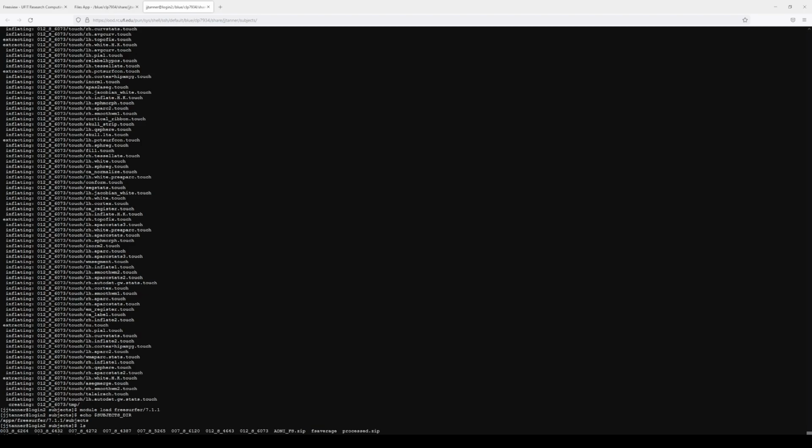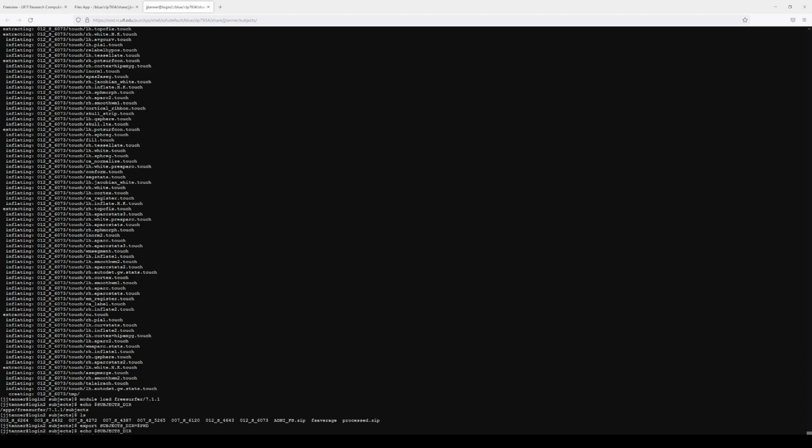So now if we look back at this command, I did echo subjects directory before, and I got apps FreeSurfer 7.1.1/subjects. I'm going to run that same command. I hit the up arrow on my keyboard, and I run that, and now it is blue CLP7934 share JJ Tanner subjects. So I have changed subjects directory.